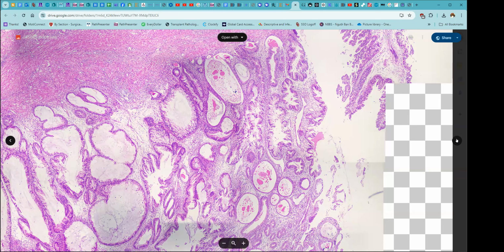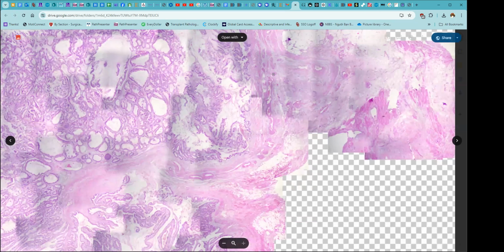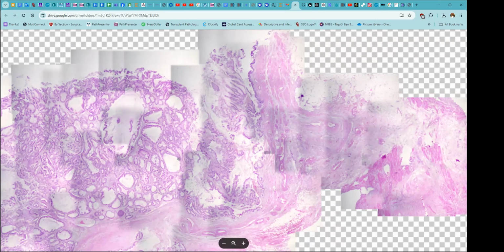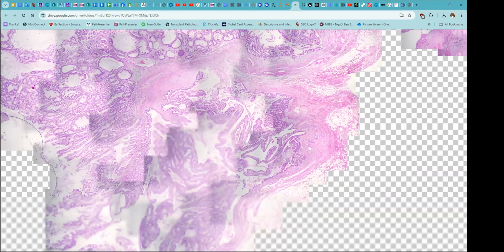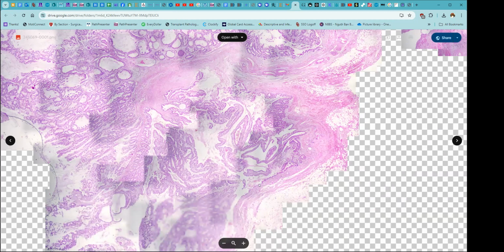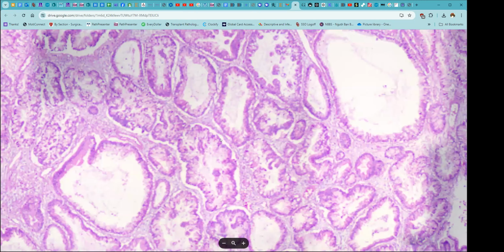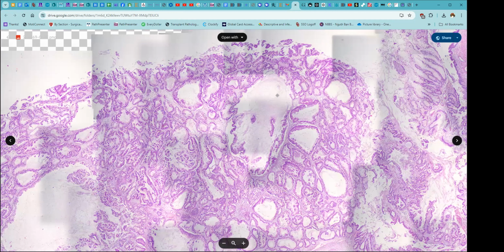We have one more slide, I think, that you sent here showing, again, this picture with muscular type tissue bounding the neoplasm. And everywhere seems to be fairly defined. So I can see how that would be difficult for urine to pass through this, but I don't see features of a high-grade aggressive neoplasia in this lesion architecturally.